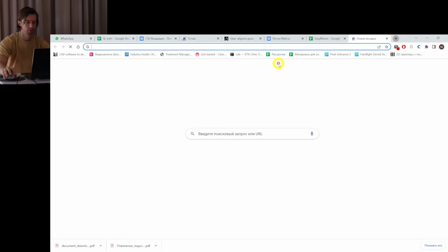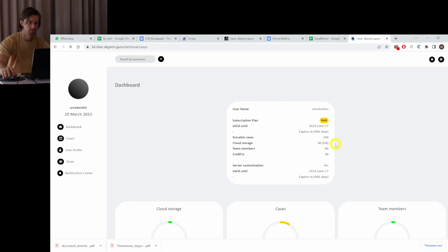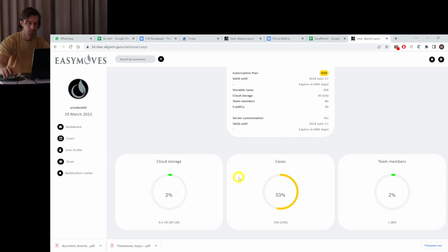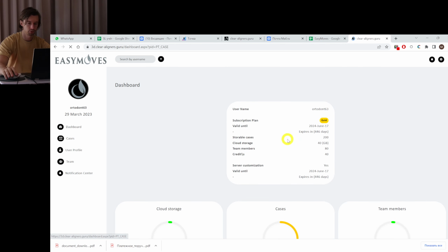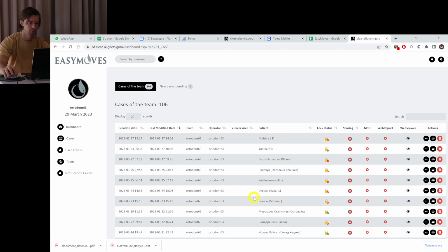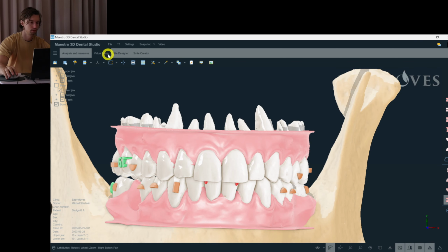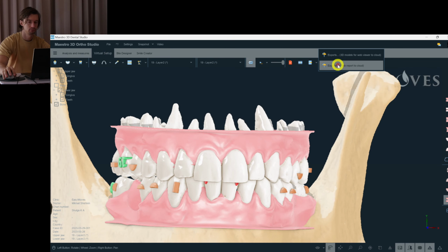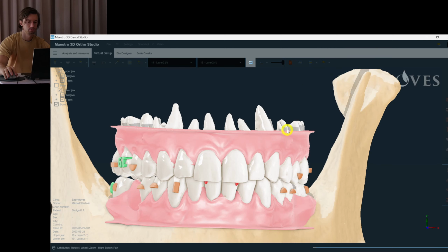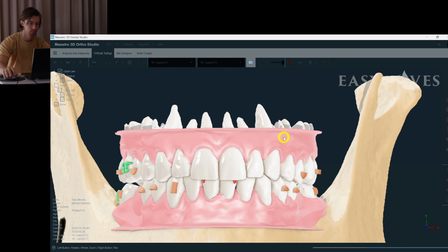Where is it? I had to buy the gold subscription recently because I have uploaded more than 100 cases within the last 2 months. So now I can keep up to 200 cases uploaded in the cloud.